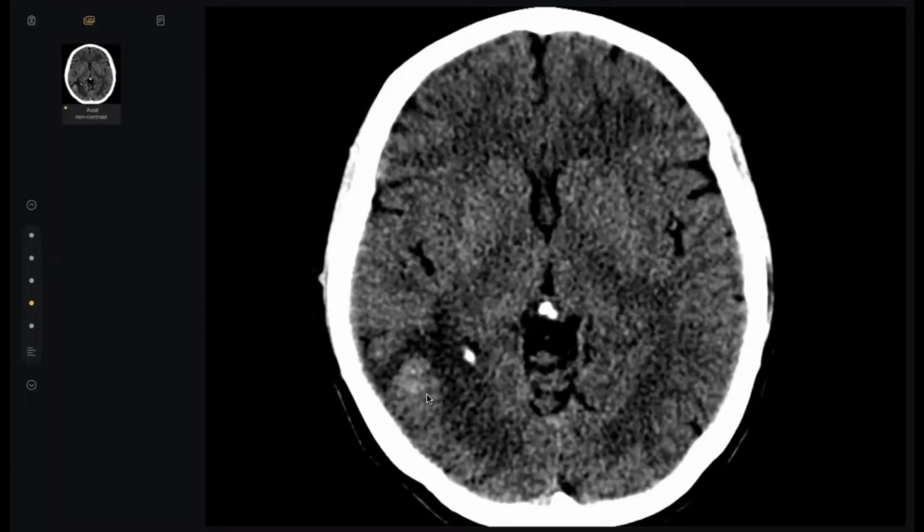Excellent. What's your next step? Sir, MRI brain. And also some calcified specks are noted in the intraparenchymal region.